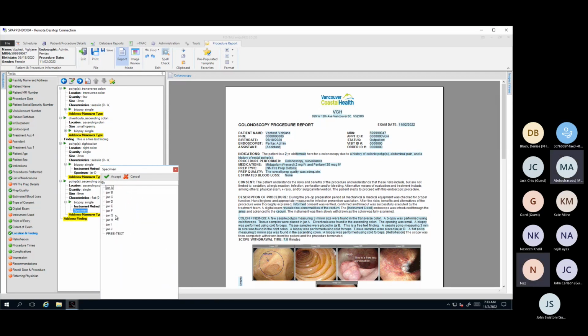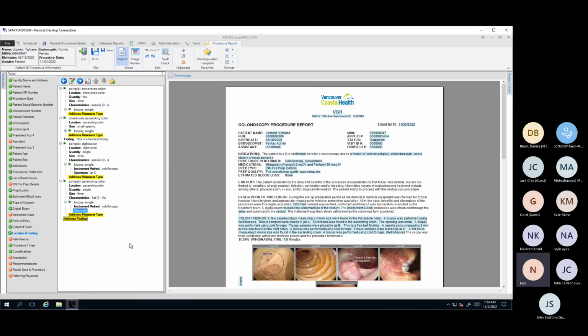Munir, this is still showing up as flowing text. Okay, so this is not what you were referring to. No. Oh, okay. Do we have to say jar? What if we don't want to do the jar? If you don't want to, you could just hit accept and bypass it altogether. That's not mandatory. I can take that offline because this is very tedious to read. You want the numbered list, basically, Munir. Yeah, just say number 1 this, number 2 this.